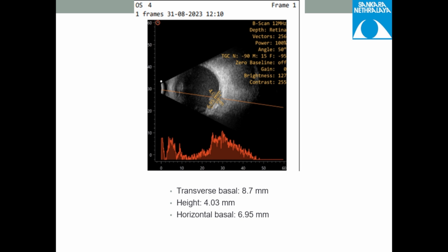So ideally, we don't want this picture at all. It's like if I have to name a person, I write the name on his face. Dr. Chetan Rao, write my full name on my face so nobody can recognize me. So this is a very useless way of doing this. You can do it somewhere here in the black areas. You just tell us where you have put the calipers. That's more than sufficient. But this description at the dead center doesn't make any sense. Our dear friend, I know. Let us not name him.